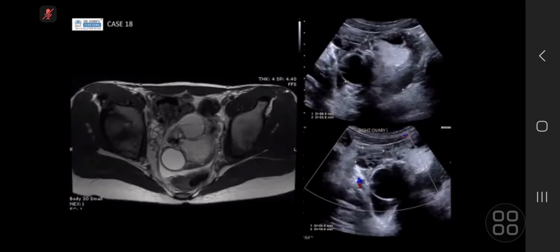So next one. Yeah, I've been provided with the T2 MR axial section and ultrasound of the pelvis, showing evidence of an ill-defined T2 hyperintense lesion, which is involving the left ovary, because I could see the follicles in the right ovary separately. I could not visualize the left ovary here. And the lesion in the ultrasound is showing hyperechoic foci and also a cystic component.